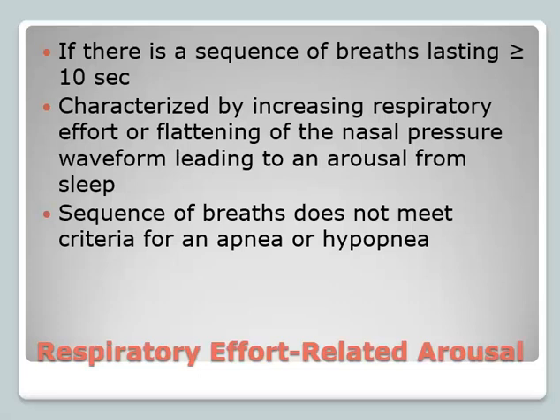So if you start to see that squaring off or flattening of either your RIP belts or your nasal pressure, or you have a lot of snoring, and sometimes you'll see the snoring severity increase, that results in the patient waking themselves up, that's the definition of a RERA. Part of the definition is you have to have an arousal. You don't have to have an arousal to score a hypopnea or an apnea. You do have to have one to score a RERA.